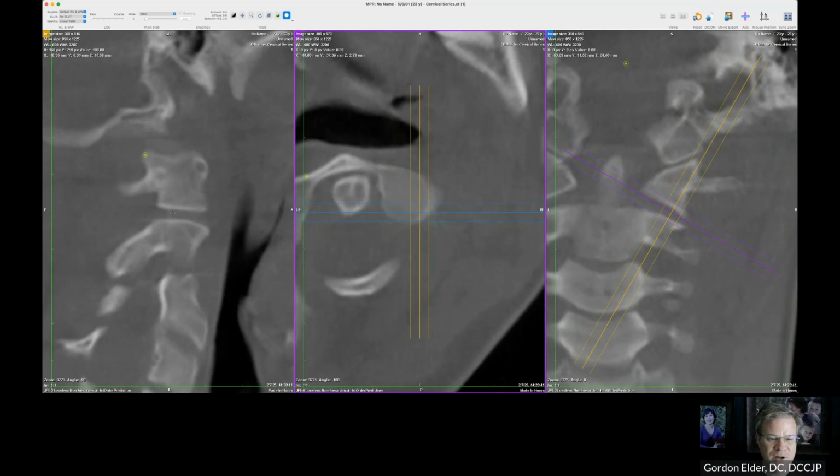This one here, okay, slightly anterior, very slight. I'm pretty sure this is not going to play into this case, but I write it down. Okay, so that was extra, not Blair.